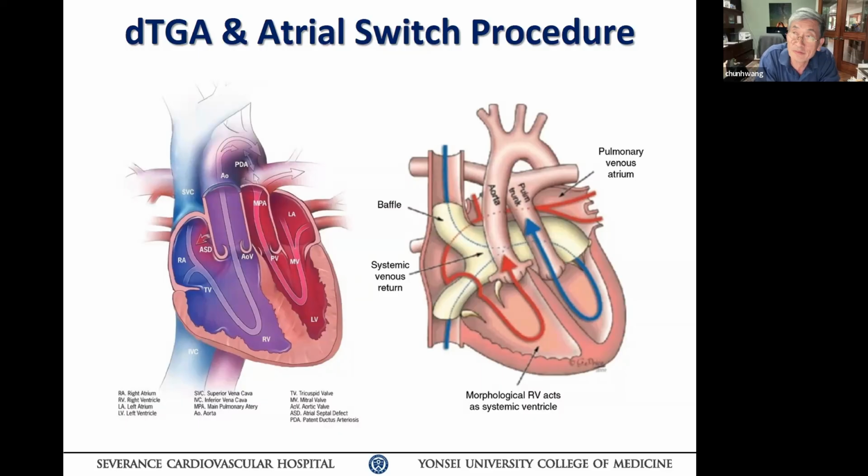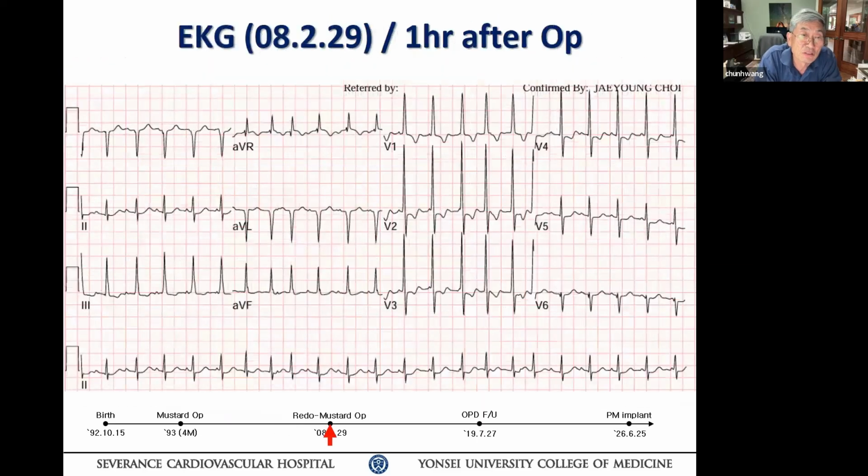Go back to the ECG first. That's why, take a look at that. In lead 2, if you look carefully, there's a little hump in the front. That's what we call half a P wave. Lead 2, yeah. You see, sometimes it looks negative, sometimes positive, sometimes flat. Go to the next one, your P wave gets smaller and then bigger again. This all has to do with the volume fluctuation change.